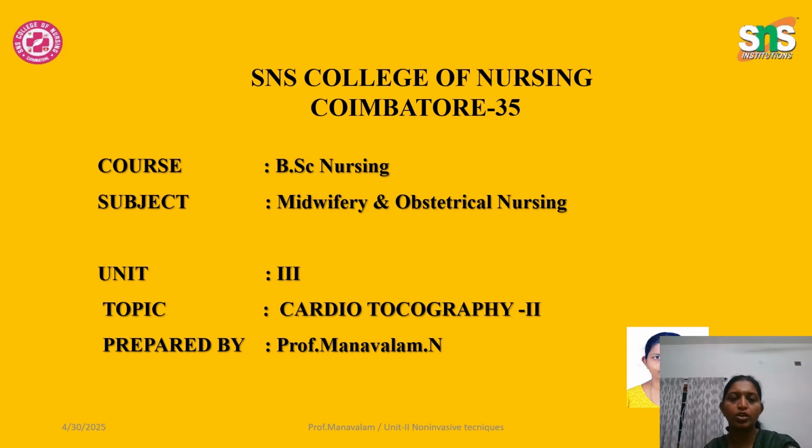In this video, we are going to see about cardiotocography part 2. It is a continuation of cardiotocography part 1. In this part 2, we are going to see about the baseline fetal heart and variability in the fetal heart. At the same time, any changes that occur in the baseline fetal heart rate, what will be happening to the fetus, that we are going to see in this video.